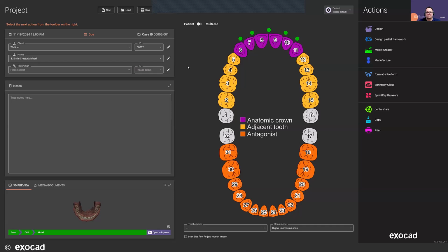Depending on the workflow, like with duplicate dentures, for instance, we have another webinar session, we have two more coming up, and I encourage you all to join that one. We'll discuss that as well. Duplicate dentures is another great feature and one of the primary reasons for the tooth segmentation, because it allows you to copy the gingiva exactly from that existing denture, using the segmented teeth and the segmented gingiva.